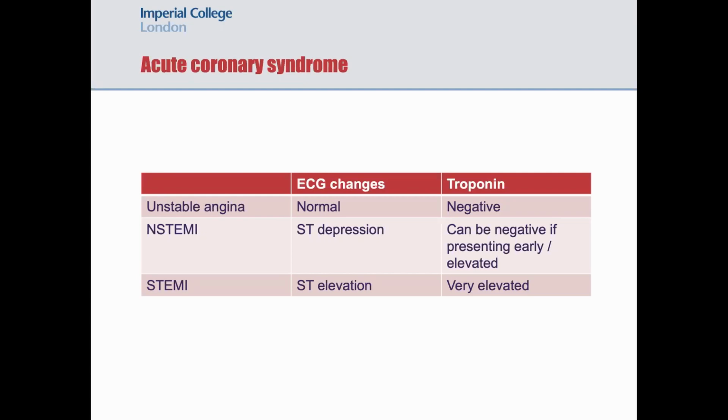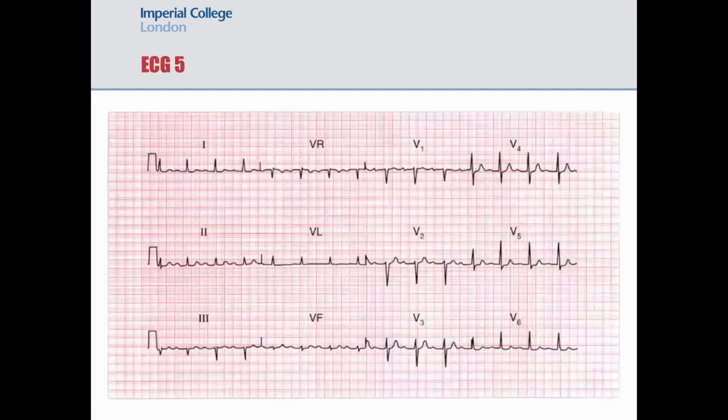If anyone wants me to go through the management of STEMI, just write the question, and we can do that at the end. Otherwise I'm just going to carry on. Same format: just note down what you think is wrong with this ECG.